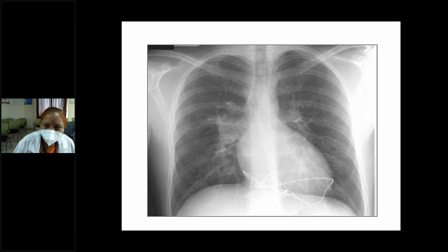Anybody? Just read this X-ray, try. This is a class, not an exam. You can try. If you make mistakes, I will correct it.